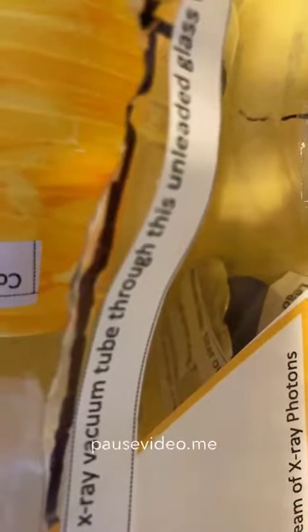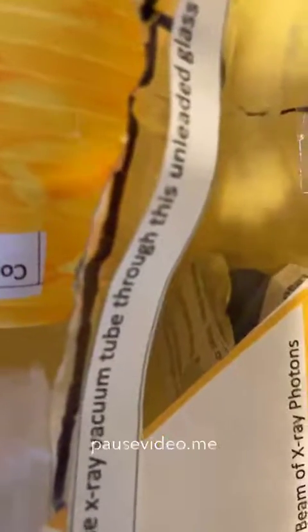Then moving on, right in here you can see a little blue circle. This is called the lead collimator, and it restricts the size of the X-ray beam. It's right in there. Then if you see right here, that is the aluminum disc. This aluminum disc filters out non-penetrating longer wavelengths of the X-ray.